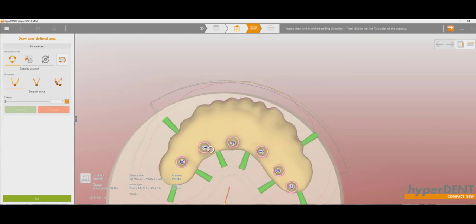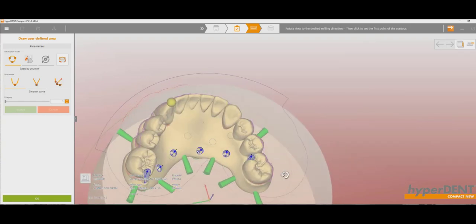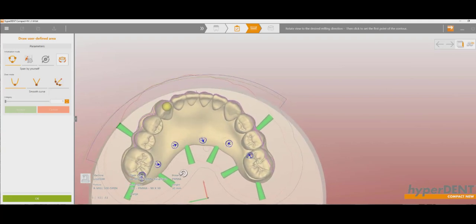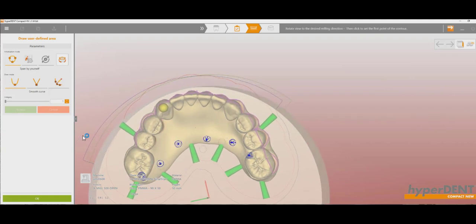So you do want to make sure those are coming all the way down, and that all these lines in the screw channels look like they're straight. Any discrepancies there, you either need to check your design or check with your designer to see if you need to make any corrections there.